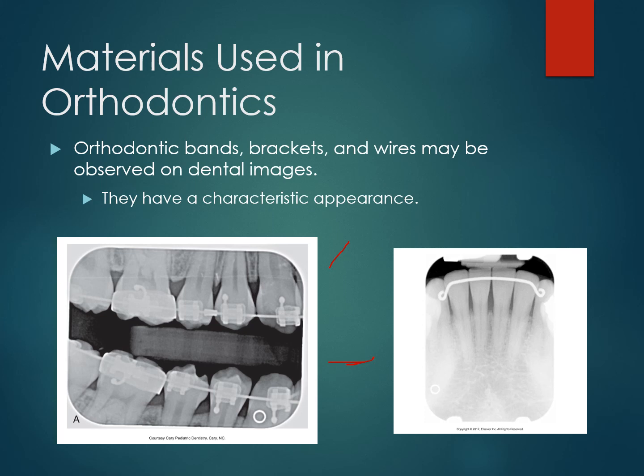You're going to see these on your x-rays and you'll be like, oh yeah, that's what that is. But the orthodontist is going to put things in your patient's mouth where you have never seen that before. You have no idea what the heck that is. And unless you have your patient sitting right there and can have them open and look at it and ask, hey, what did you do here? What is this? Why is this here? Then you have no idea what that thing is. It happens a lot, actually.